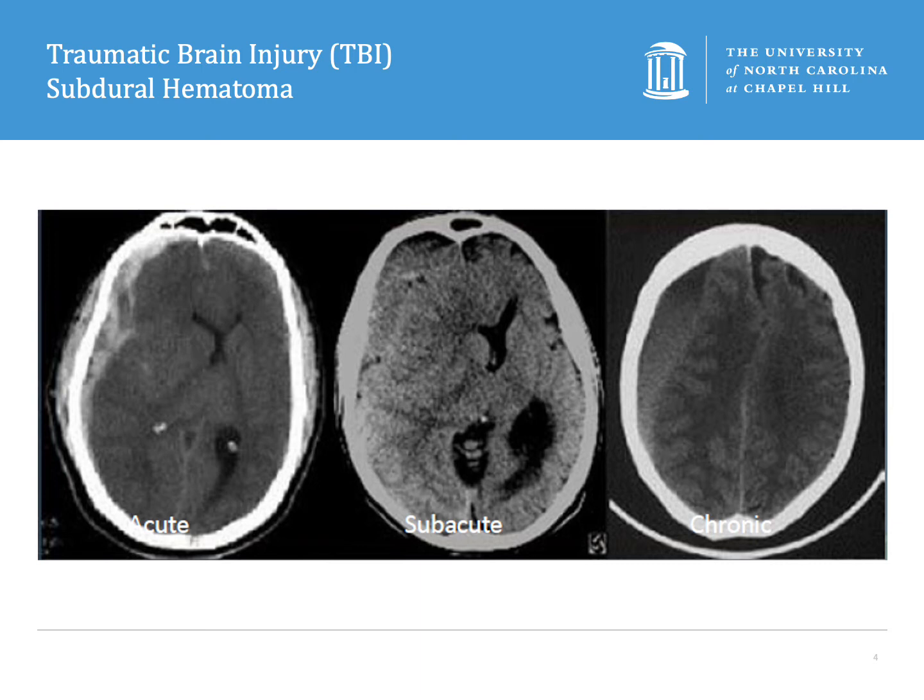So in contrast, subdural hematomas are hemorrhages in between the brain tissue and the dura. They can vary in appearance on CT due to the age of the clot, so they don't have to be acute. But an acute subdural, which is also going to appear hyperdense on CT like you see on the left here, can warrant emergent surgical evacuation if there's a neurologic deficit that correlates to the hemorrhage and/or the clot is greater than 1 centimeter in greatest diameter.